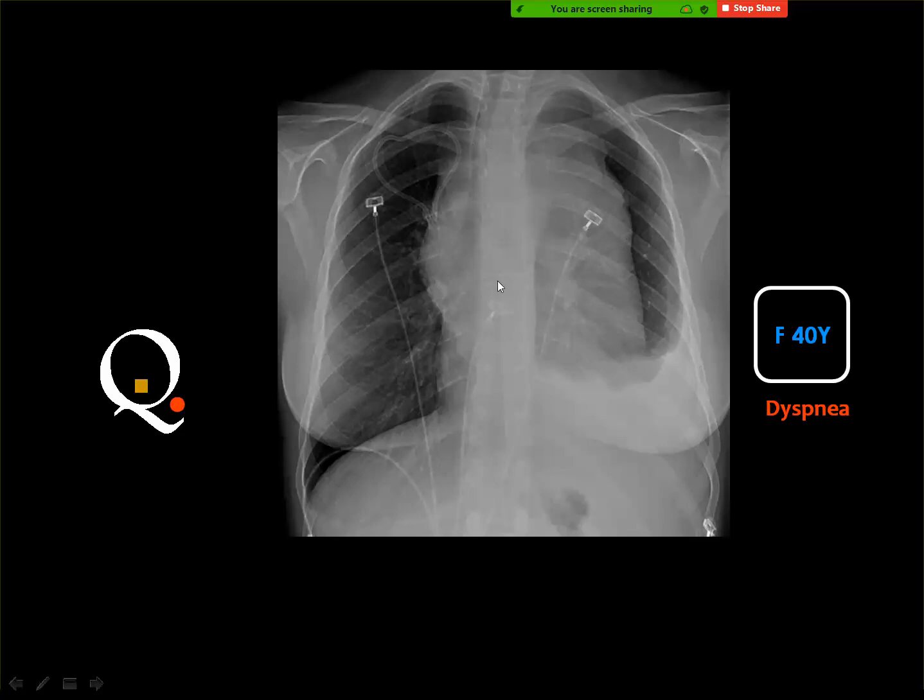The mediastinal mass, which is central in location. Aortic aneurysm. Retrosternal goiter. Lymphoma. Okay, then let us assess all the possibilities. Retrosternal extension of the thyroid: if you see the upper border of the mass, this will exclude this possibility, because in retrosternal extension you cannot see the upper border of the mass.